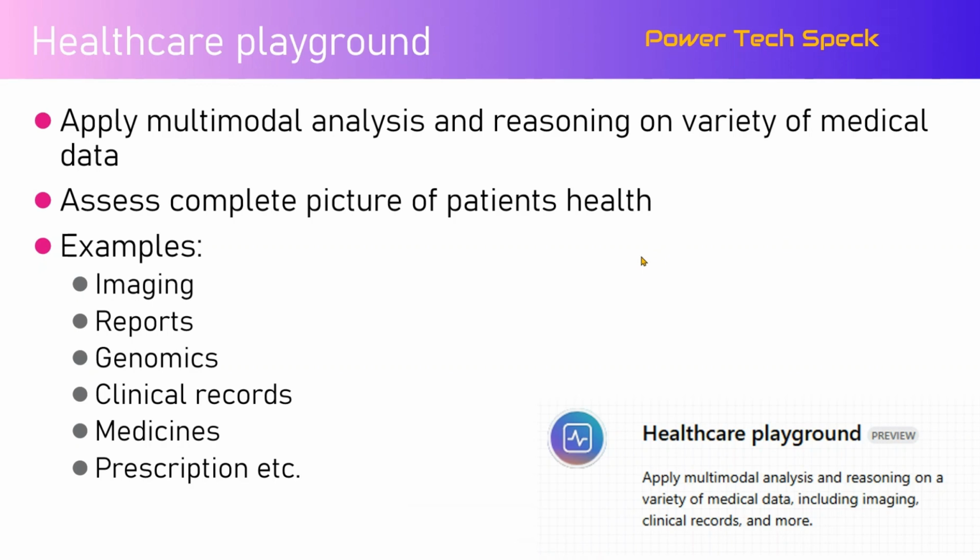On the basis of that, it will start collating that information and then try to give you a reasoning behind the disease, and then it will also give you a treatment plan. Now again, this is all still in a testing phase, so you should not assume that it will give you the correct response, but this is the path forward in the medical domain, whereby you can understand the responses which the LLM provides on the basis of the records.